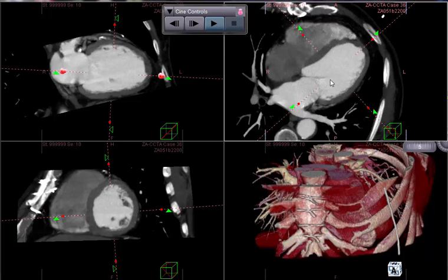This is CCTA case number 36. This is a 64-year-old man who was status post-coronary bypass surgery who's had an abnormal stress test suggesting anterior and inferior wall ischemia. This is a 10-phase study to look at his overall left ventricular size, shape, and function.